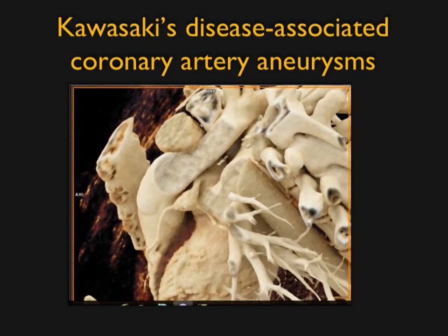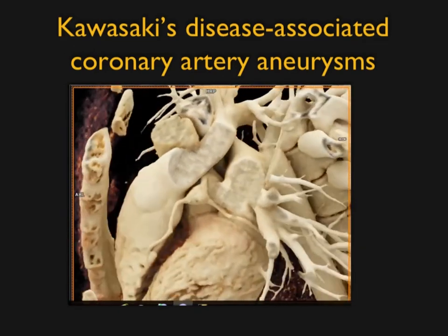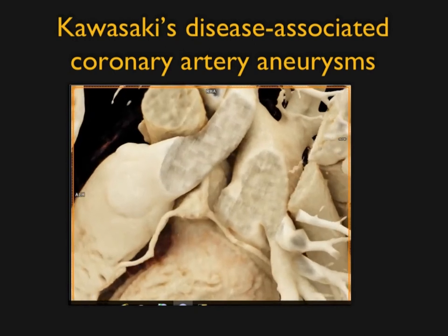You see the right coronary arising off the right cusp, and you can see the patient has two coronary arteries. So coming off that aneurysm. Again, very, very nicely seen.